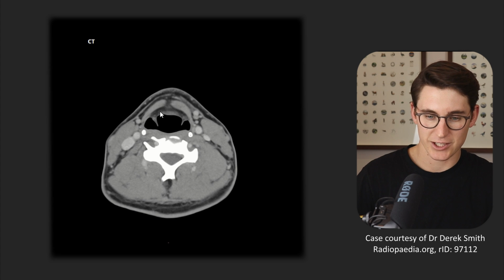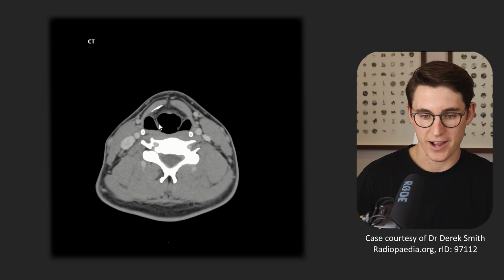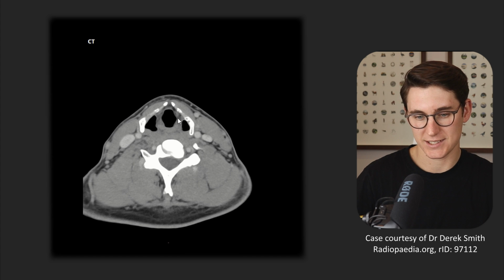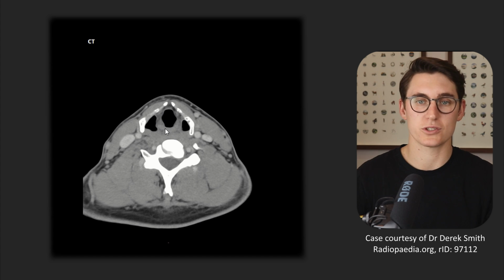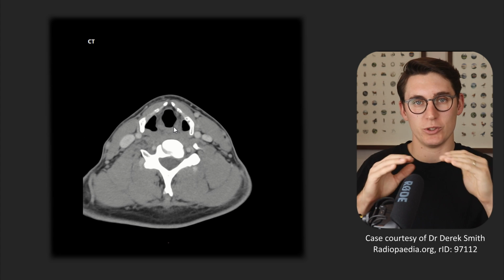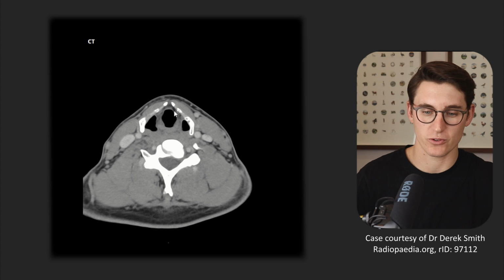Let's head slightly superiorly and try and find those false vocal cords. You can see anteriorly that fat density in our pre-epiglottic space, our aryepiglottic folds here, and as we come down, we can see that fat density coming out laterally here, and this is a sign that our folds here are our false vocal cords. If we were to scroll down slightly inferiorly, we should then come into those laryngeal ventricles below those false vocal cords.